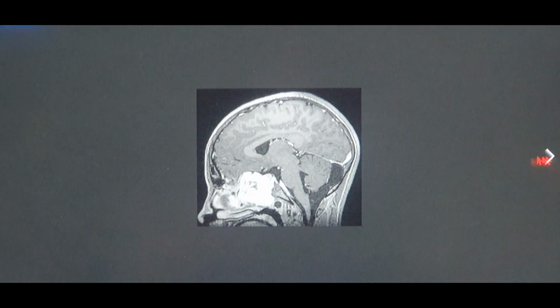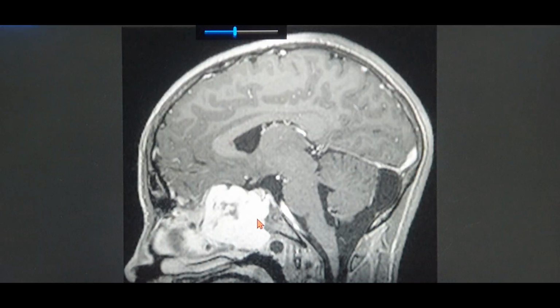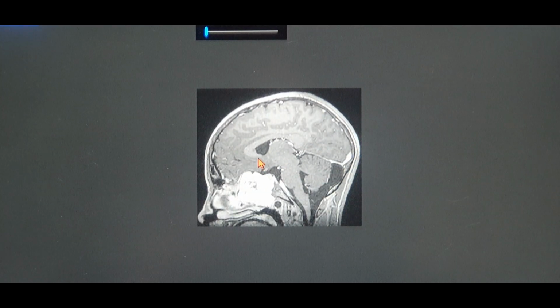So moving on to the scans of the JNA, this is a sagittal section. This is a normal JNA which is pushing on the skull base but not invading it. It is actually extradural. So this is one photograph of the JNA. This is actually T1 because the CSF is not bright. That's a normal T1 scan.